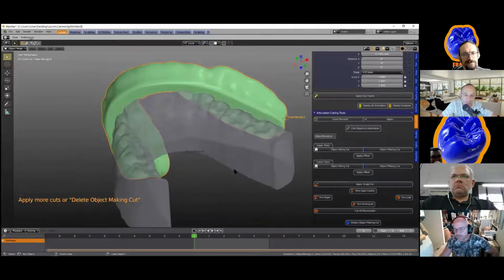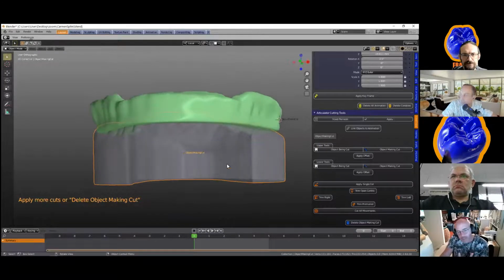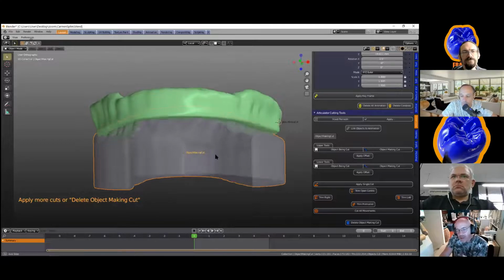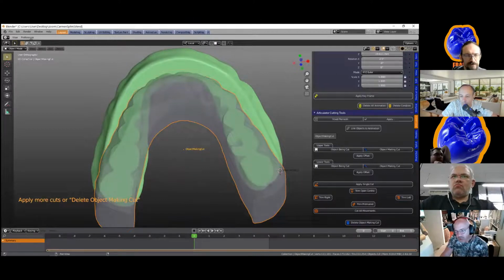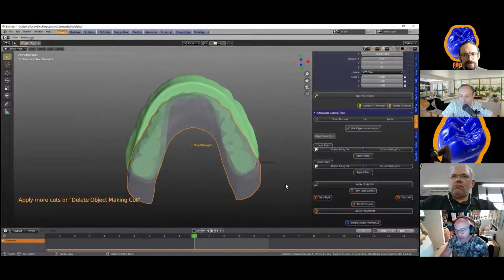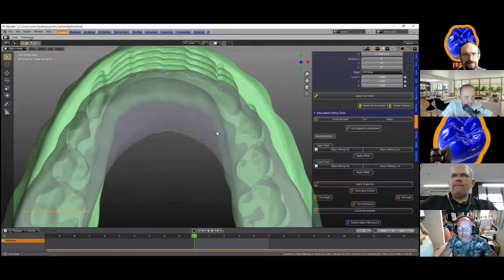Yeah, okay. If you wanted to cut, for example, a splint with only an anterior bite rim, and you just wanted to make a protrusive plane, you would only trim the protrusive over here. So let's just try that. Trim protrusive. And that's moved the jaw animation forward like that. So there are no other cuts.